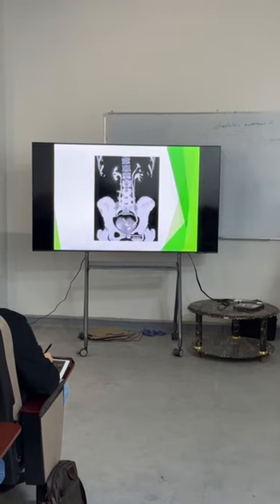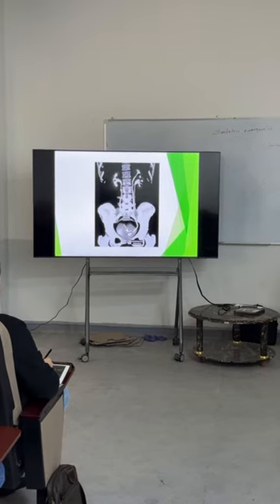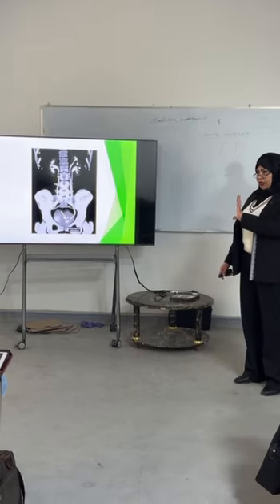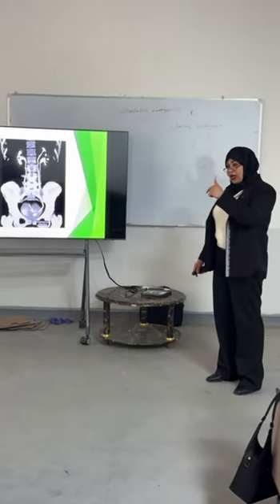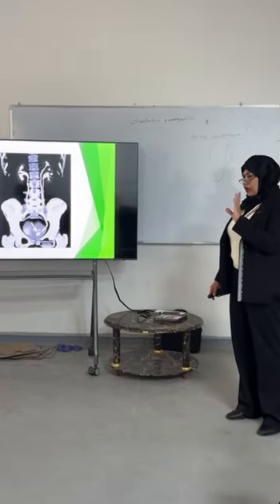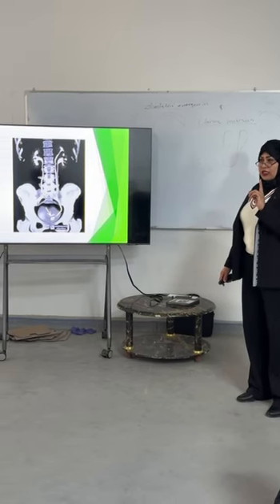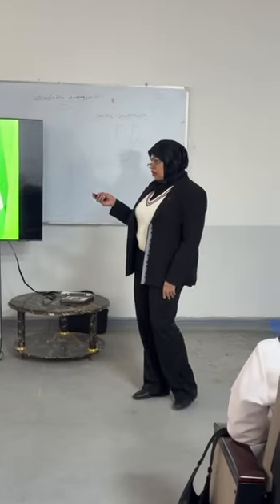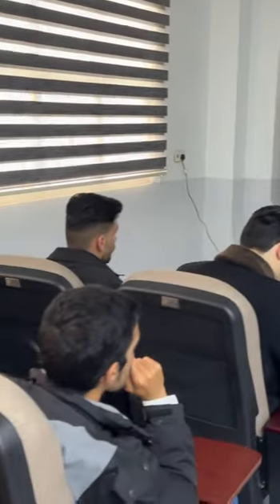This is a circular hyperdense structure. Look, the stone is white, so we can see it on a plain X-ray, KUB. But in the IVU, the contrast is white. If it passes and the stone is also white, you cannot see the stone. So the IVU study is just for showing the level of obstruction or congenital anomaly like this. This is a cobra head. It is cystic dilatation of the lower ureter.